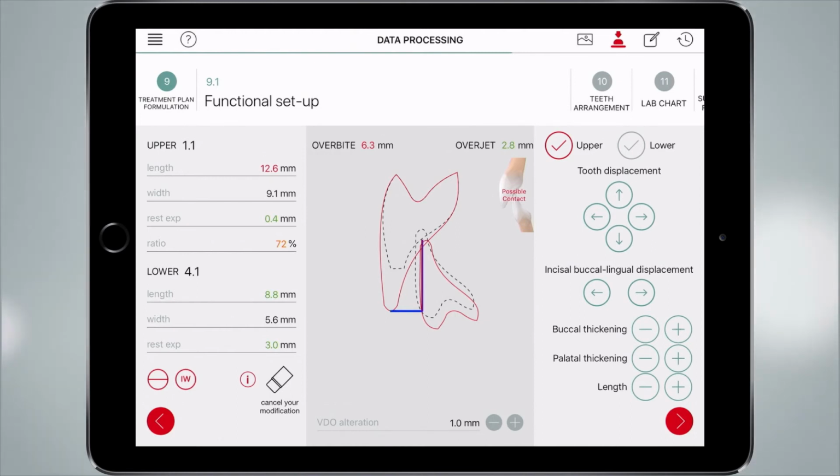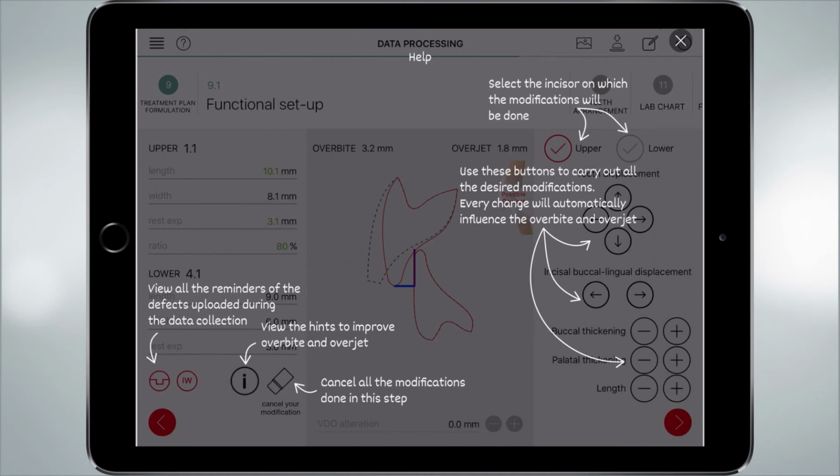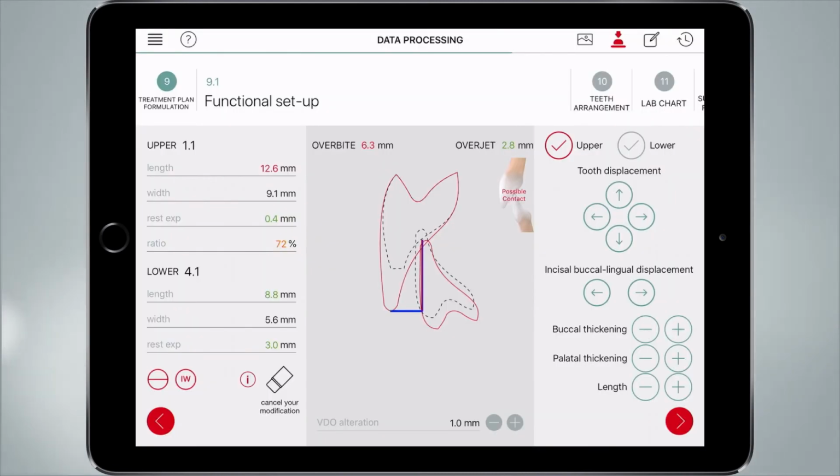Plus, go to the upper part on the left side. You see the question mark? The question mark, if you push it, look, is all the information on how to use all the buttons. That's not only in this screen, but is shown in other screenshots, not just in this one. So this one is one of the screenshots where you can find all this information. This helps you a lot, incredibly. So going back to the main screenshot.